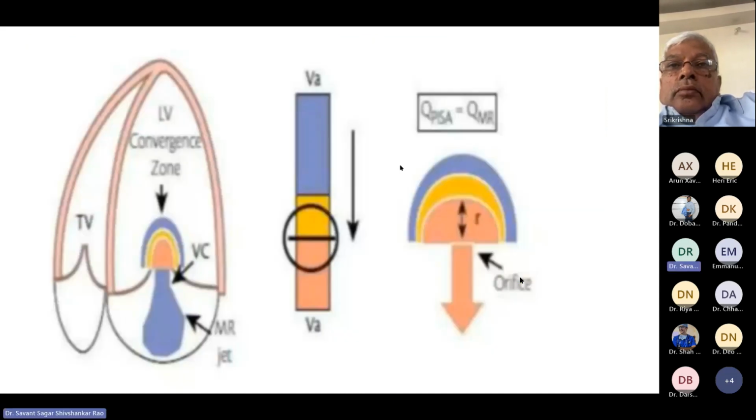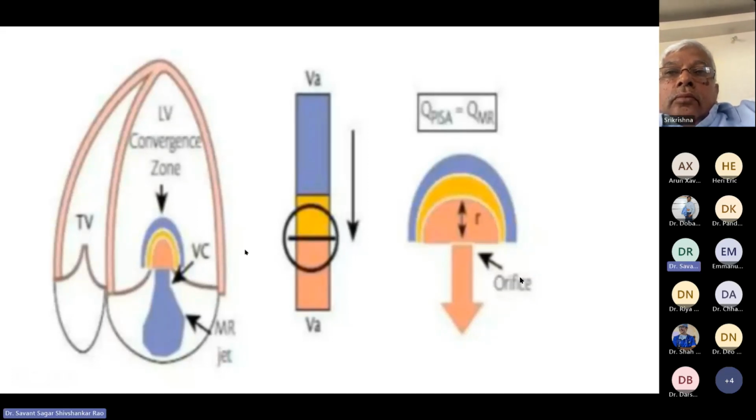This is the image showing a 4 chamber view, taking a color Doppler at the mitral valve, reducing the aliasing velocity. This will create the aliasing at the level of the mitral inflow, and we get a hemicircle, shown in the image as the orange hemicircle. In this hemicircle, we measure a radius, which is used as the PISA radius.